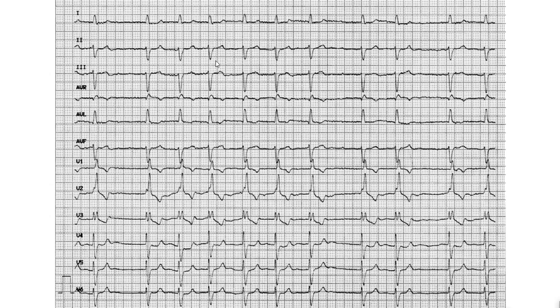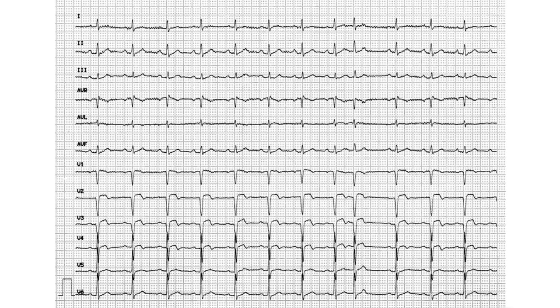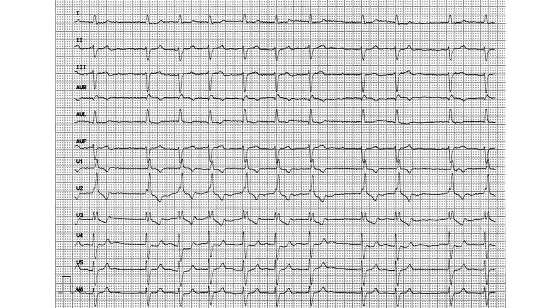Again, I want to highlight that to calculate heart rate, as always, you just go 1, 2, 3, 4, 5, 6, 7, 8, 9, 10, 11, multiply by 6, 66. That's the heart rate, okay? Easy as that. In all the previous examples, you can do the exact same thing, whether it's regular or irregular. 1, 2, 3, 4, 5, 6, 7, 8, 9, 10, 11, 12, times 6, 72. Yeah, and you're done. It's very easy. Those are the main things that I want to highlight about them, and for that, we are pretty much done.